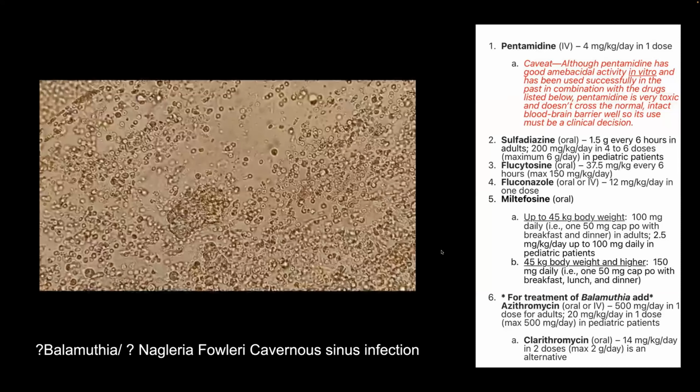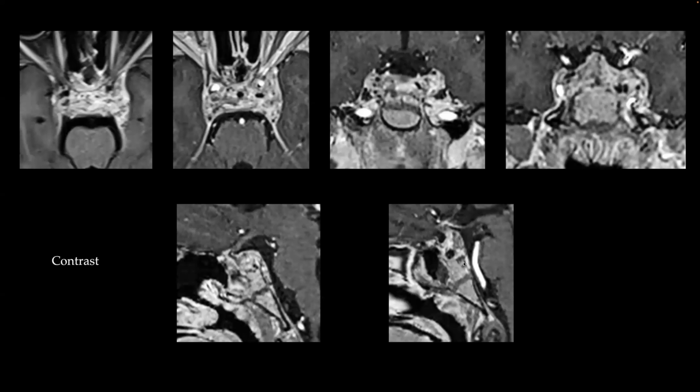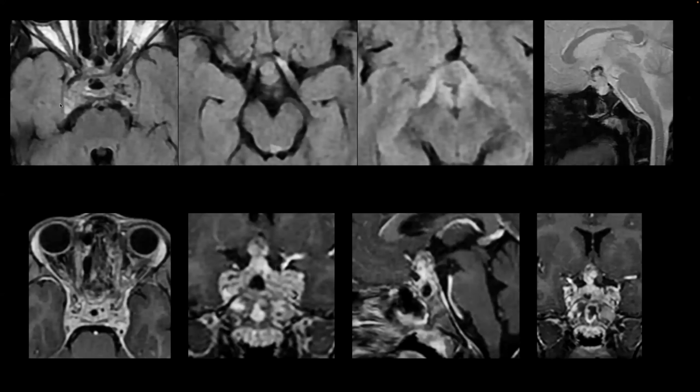She initially improved, and the other scan was done around a week later. She had gradually improved clinically, but there was extension shown in the MRI. All right, so this is the last MRI we saw, and then we had a follow-up MRI. So this is the follow-up MRI.